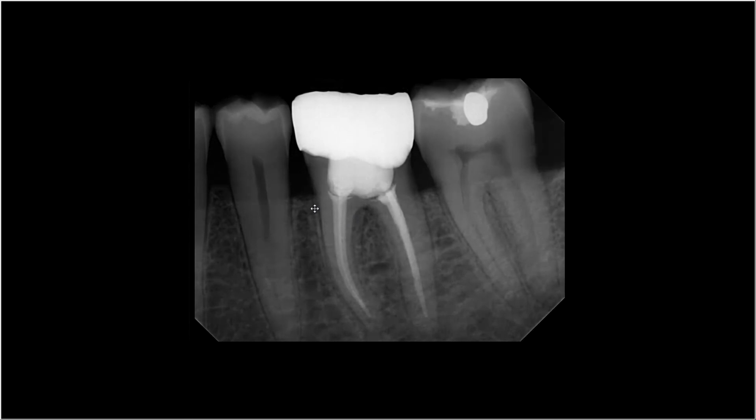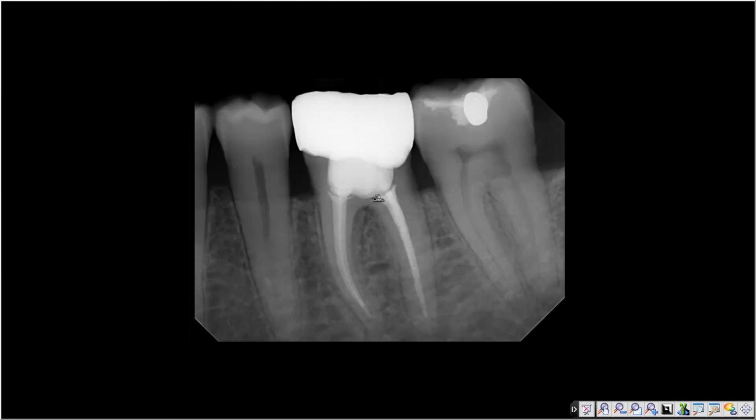This is going to give me a better fine tune without getting washed out information in the darker areas and the brighter areas of the image. And again, left clicking will bring us back to our original image.